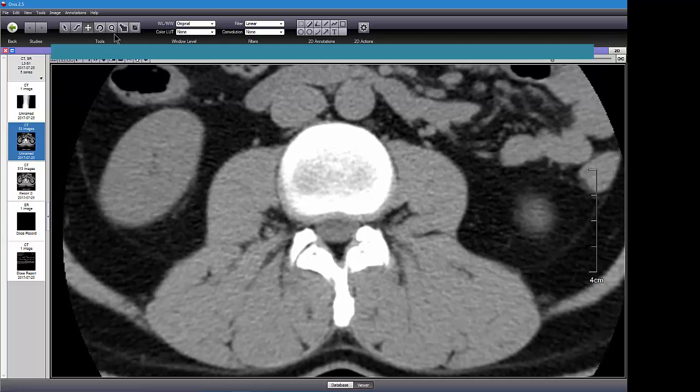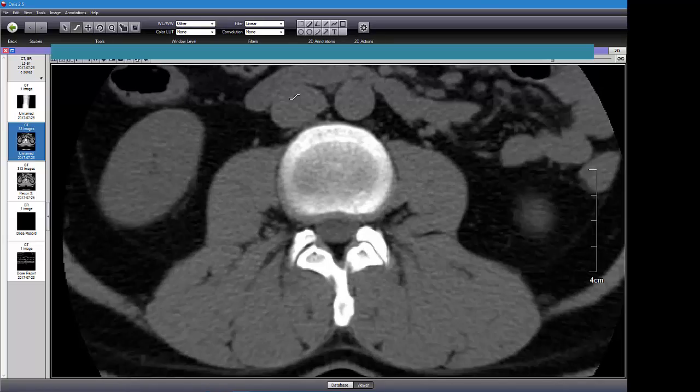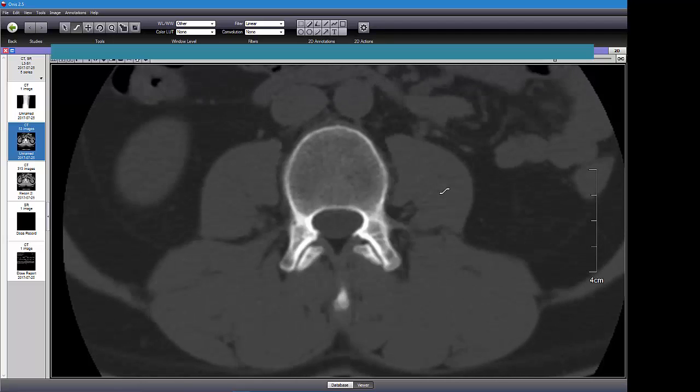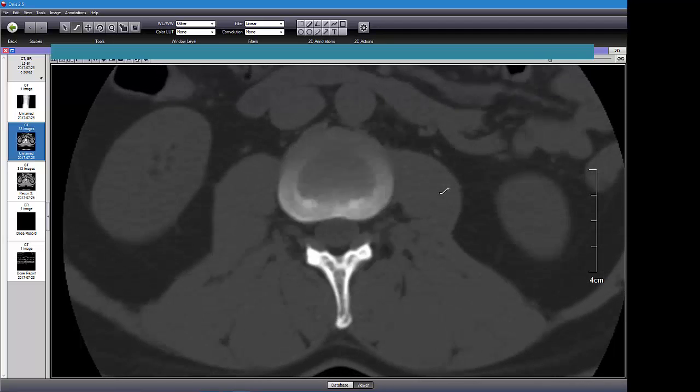All right, so let's play with the contrast. There's the contrast button, so we can get down more to bone. Make it a little darker because we're interested in seeing the pedicle screws here. Now we're up high. The cut lines won't work here, right? Because there's no sagittal image. But well, let's start from the bottom.